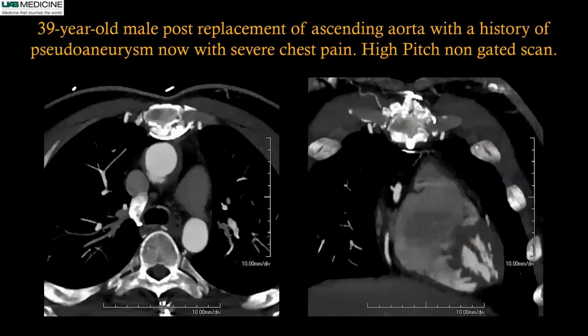So other non-atherosclerotic disease can also involve the coronary artery, such as this, and can lead to significant narrowing and symptoms. This is another patient, 39-year-old, who had a replacement of the ascending aorta with pseudoaneurysm formation after the surgery, and now he's presenting with severe chest pain. And this was just a regular CTA done without gating. We call it a high-pitch non-gated scan. This was done at the outpatient service.